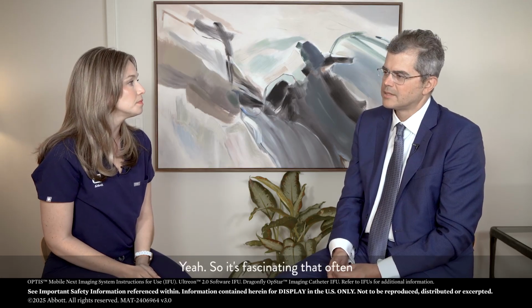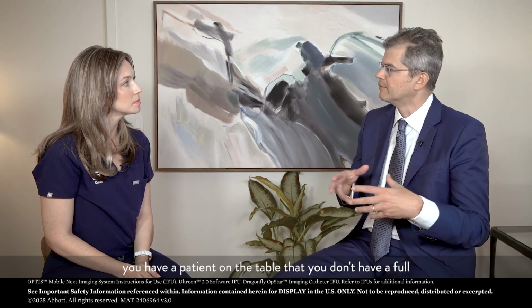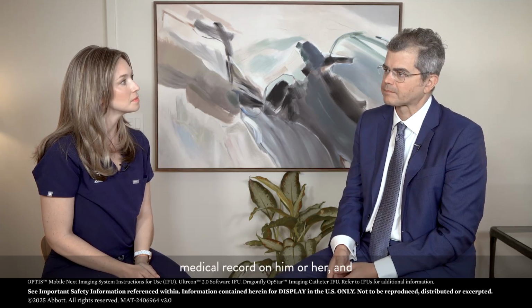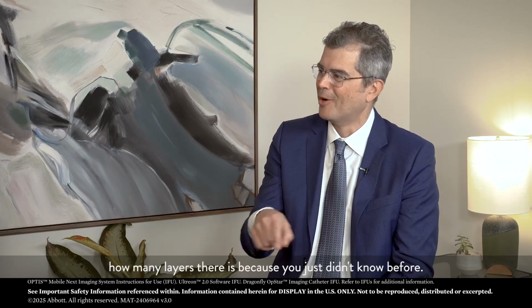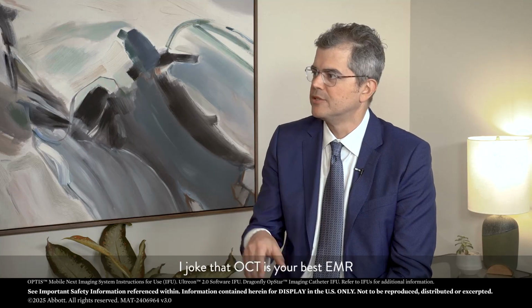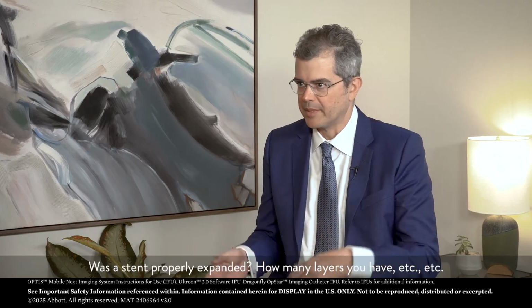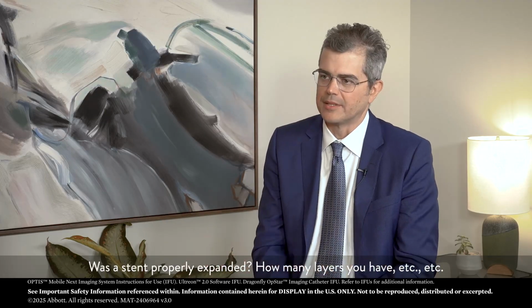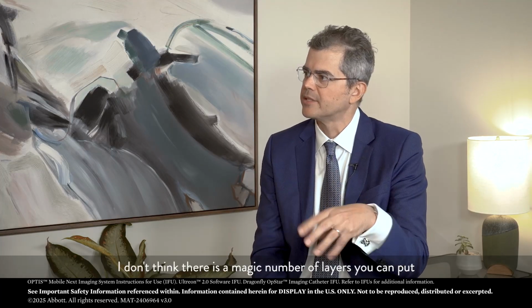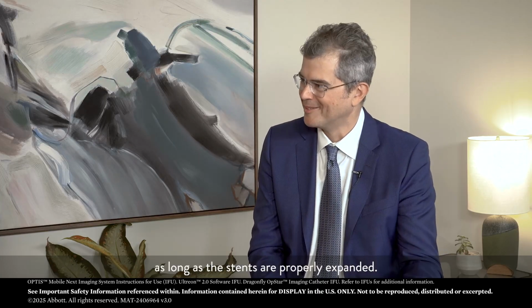Yeah, so it's fascinating that often you have a patient on the table and you don't have the full medical record on him or her, and it's the OCT telling you how many layers there are, because you just didn't know before. I joke that OCT is your best EMR because it's going to tell you the whole history: was the stent properly expanded, how many layers you have, etc. Specific answer to your question, I don't think there is a magic number of layers, as long as the stents are properly expanded.